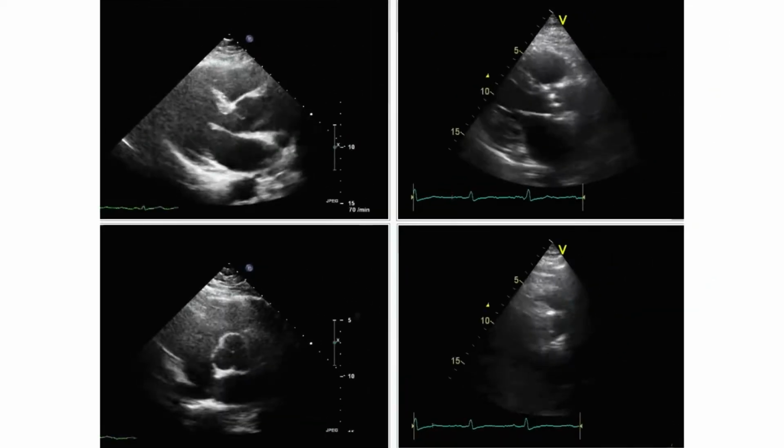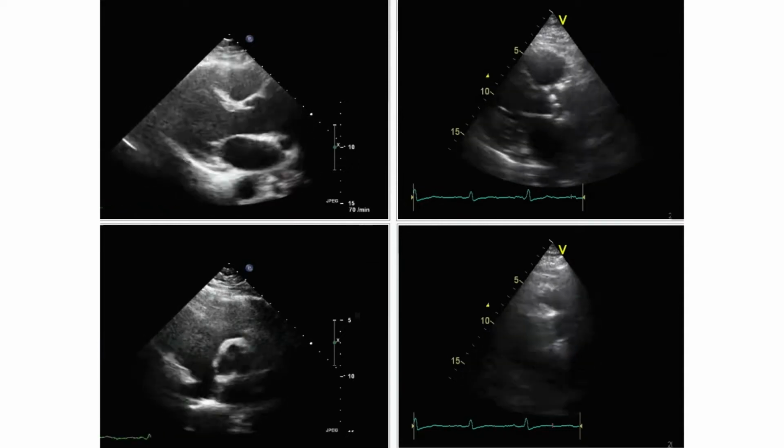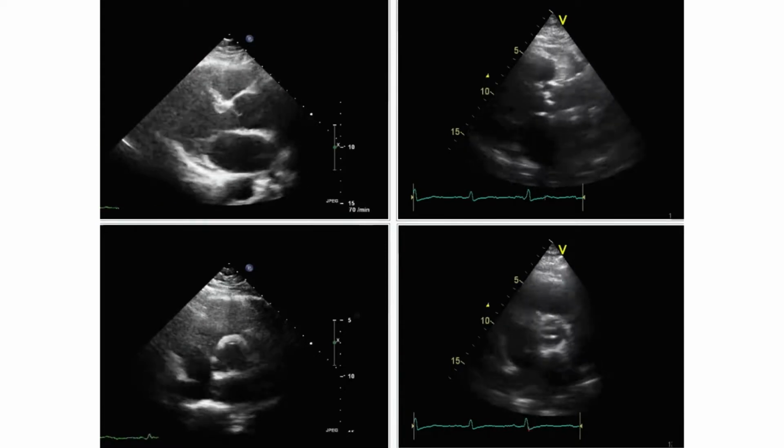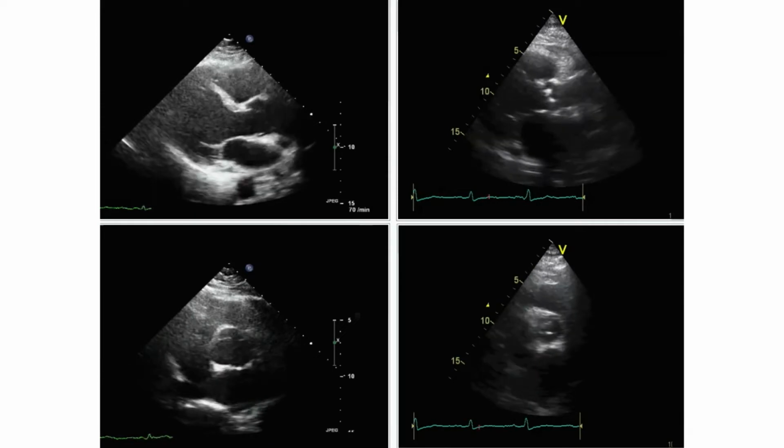Can you say which one of these aortic valves is a good one and which one is a bad one? This time we won't give you so much time, we want you to be quick. So just have a quick look. You can do it, it's really easy. You already trained your eyes.